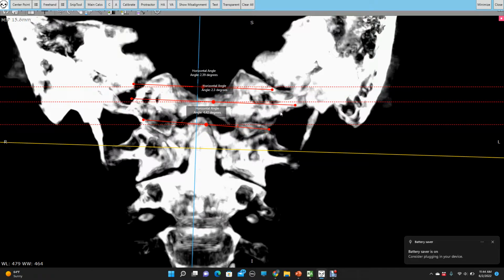So that's how they got away with it, by having X-ray superimposing everything. Then it didn't matter the thin slice, but it is something we need to be a little wary of when we're measuring all this on a single slice. It's, hey, it's easier to see, it's right there, nothing superimposing, but we may not be measuring through the same parts of the atlas, and that may be changing what we're measuring.